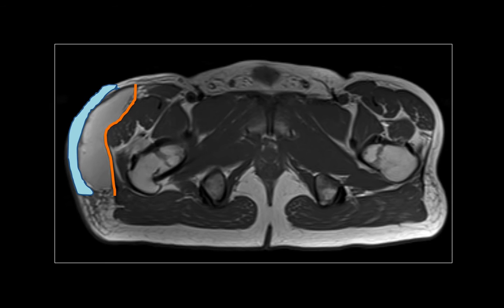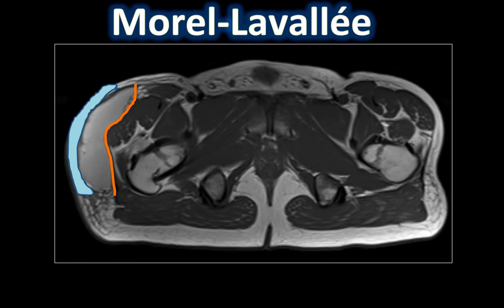Now, if I tell you that this patient was involved in trauma a few months ago, combining the imaging appearance with such information would make you reach a specific diagnosis of an entity called Morel-Lavallée lesion. This is a specific lesion that results from a severe shearing injury that leads to degloving and separation of the fascia from the overlying subcutaneous tissue.